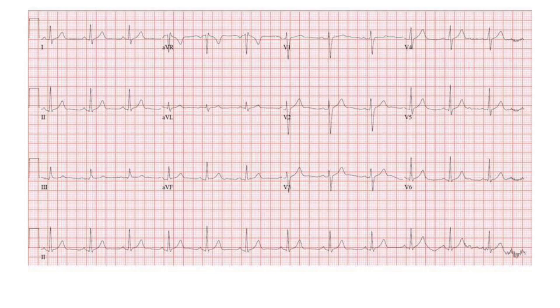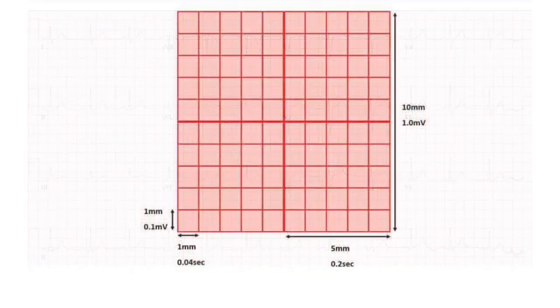You can also see that this EKG paper is made up of large squares within which there are smaller squares. The large squares are bordered by thick lines, whereas the smaller squares are bordered by thinner lines, as we will see in the next photo.